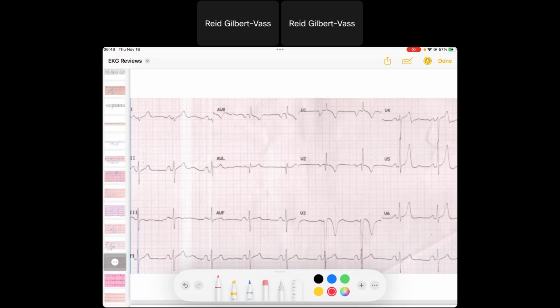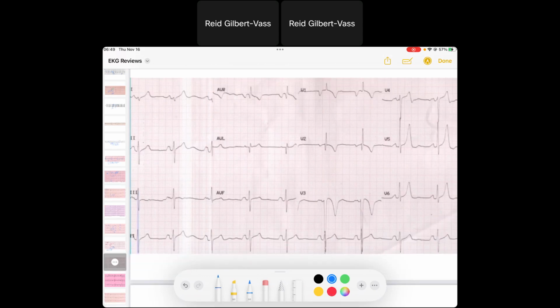Okay, so here we've got regular rhythm. We're tacking along. We've got a rate of maybe 300, 150, 100, 75, 60, 50, say, beats per minute-ish. We've got P waves that are upright in lead 1 and upright in AVF. So this is a sinus bradycardia.